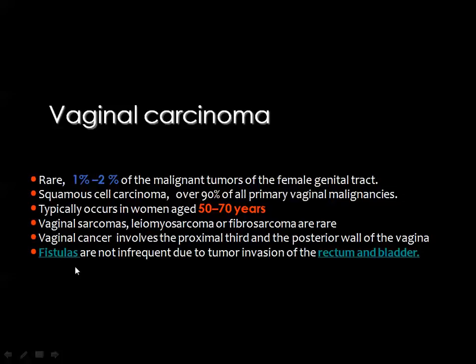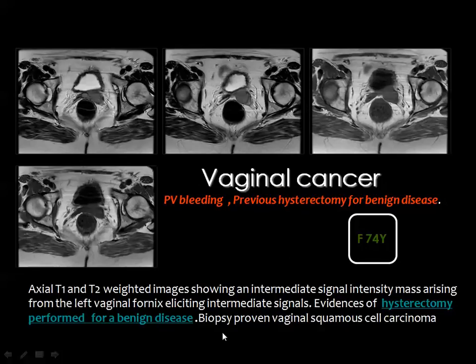Then these lesions, the carcinomas, usually have invasion of the surrounding structures, especially the rectum and the bladder, producing fistula tracts.